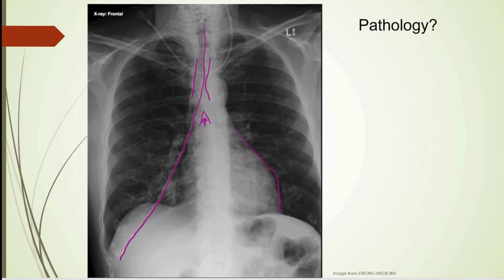The patient's right, a little difficult to see here. You can see the ribs clearly. So he may have a little consolidation going on over here as well, because you can't really pick out the cardiac silhouette.